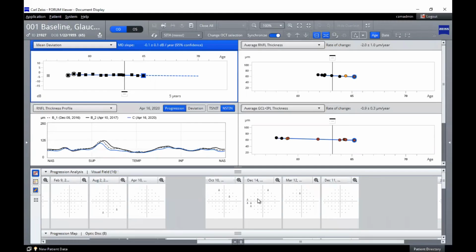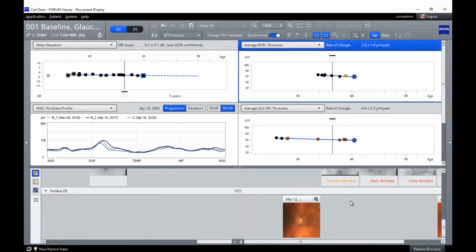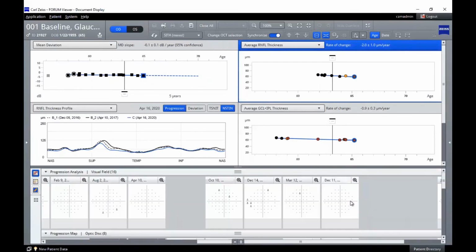So we're adding that piece in, and here you have now everything plugged and played together. You've got these multiple clinical events that you can pay attention to, analyzing and then erasing or resetting those. Because let's say, to your point, somebody did put something in error. The data is not so fixed that we're in trouble, that we can't go and course correct that.